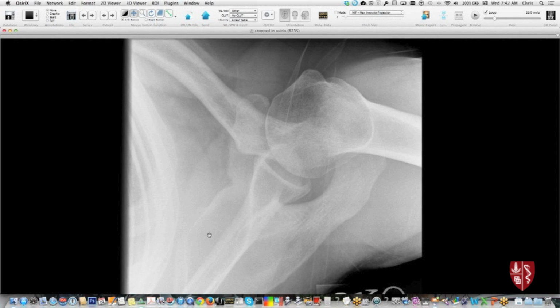If you look carefully, and you don't often think about this, but you can see the scapular spine coming up and over to the acromion here, and you see the clavicle coming across here to form the AC joint in this projection right here. So the use of that is that sometimes patients have an AC separation or malalignment, and you can tell whether the clavicle is displaced anteriorly or posteriorly relative to the acromion on the axillary view.